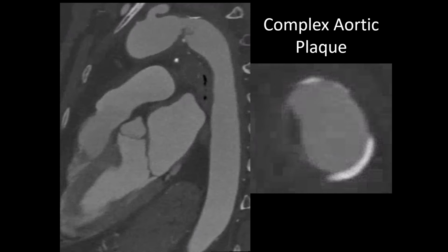If that happens in the coronary artery, you get acute heart attack. Well, this is a huge vessel, so you're not going to fill up the entire aorta. You're just going to have a big thrombus sitting there, and in certain scenarios, it stays there, and it could break off, it could solidify, so you try to target all your therapy to prevent that from happening. But it's a very similar scenario to acute coronary syndrome. It's just an acute aortic syndrome involving an atheroma.